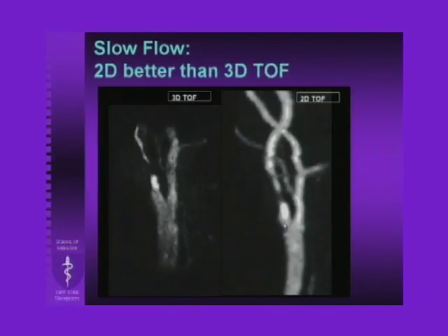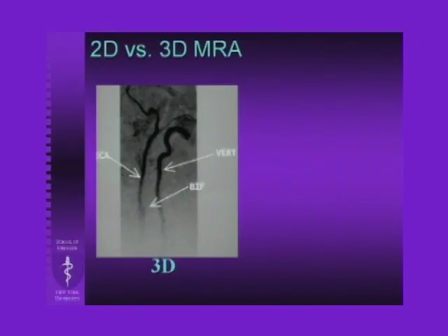That's why, by the way, we still do multiple techniques, at least a non-contrast and a contrast, just so we have an option of looking at different techniques. The 2D versus 3D, the way the MIP works is it takes a whole chunk of data, throws out about 95% of it, and keeps a little bit of the data, the brightest pixel, and that's what goes into your MIP image. Well, if your machine happens to throw out the important data because it's not quite as bright, then you'll overcall the stenosis.